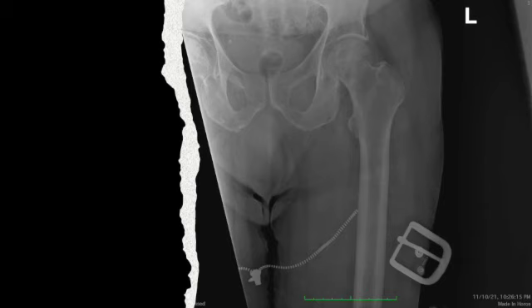Our next radiograph is also a frontal or AP radiograph of the left hip in a patient with acute left hip pain. What do you see? So we also see an acute fracture of the subcapital region of the left femoral neck on this radiograph. Here, the lateral margin of the femoral head/neck junction has an acute angle, and we see a sclerotic line or fracture involving the subcapital region of the left femoral neck.